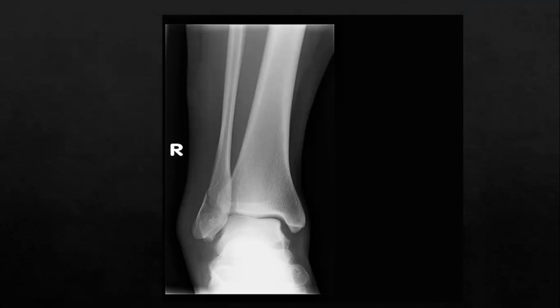Okay, so I'm looking at an AP view of the right ankle in an unknown patient taken at an unknown time. I can see the exposure's not great, but I guess it's adequate. And the most obvious deformity I can see is a fibular fracture at the syndesmosis or thereabouts. The tibia looks intact, and I can't see any talar shift, I don't think, but there might be a little bit.